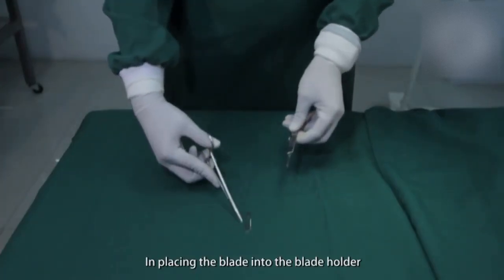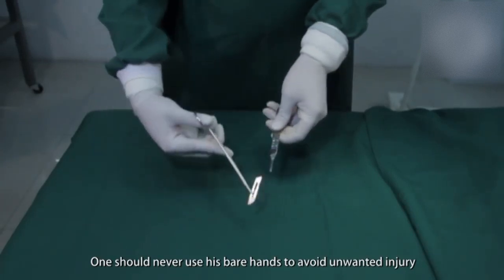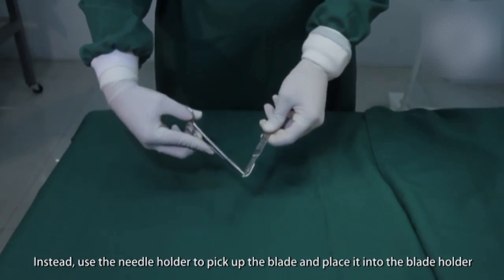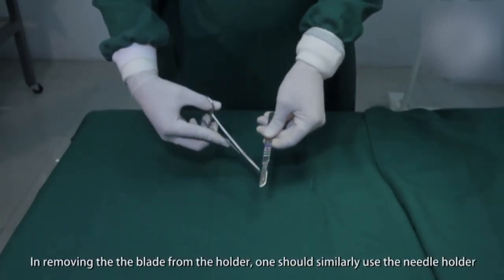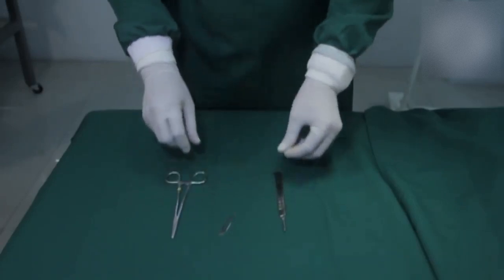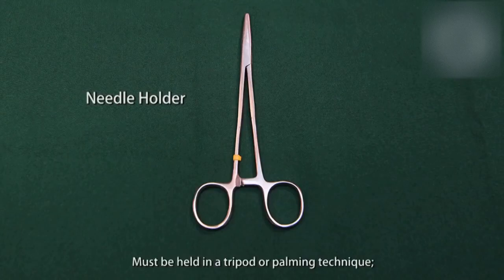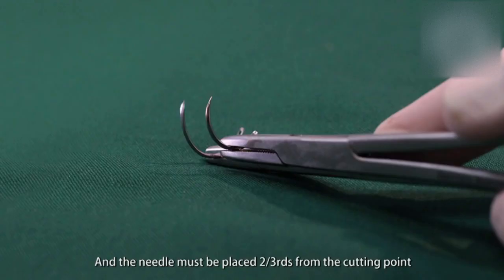In placing the blade into the blade holder, one should never use his bare hands to avoid unwanted injury. Instead, use the needle holder to pick up the blade and place it into the blade holder. In removing the blade from the holder, one should similarly use the needle holder. Needle holder must be held in a tripod or palming technique, and the needle must be placed 2/3 from the cutting point.